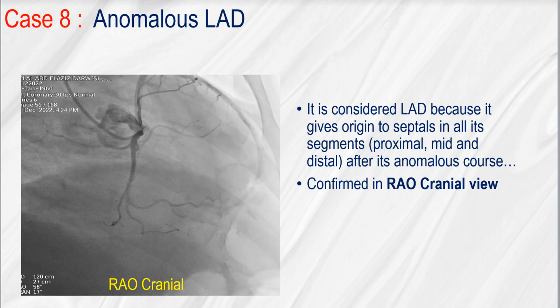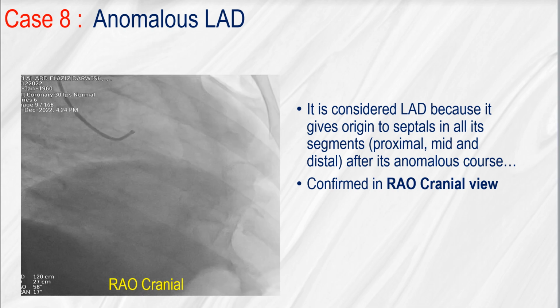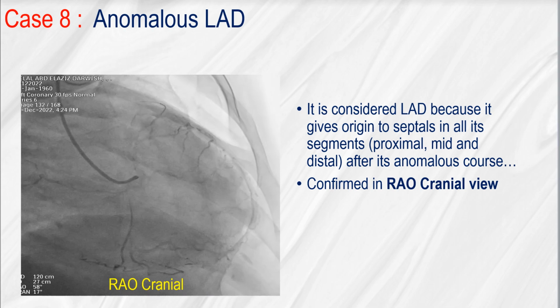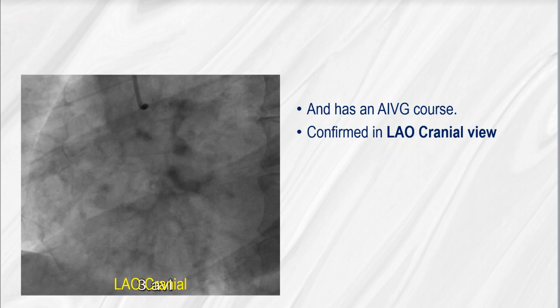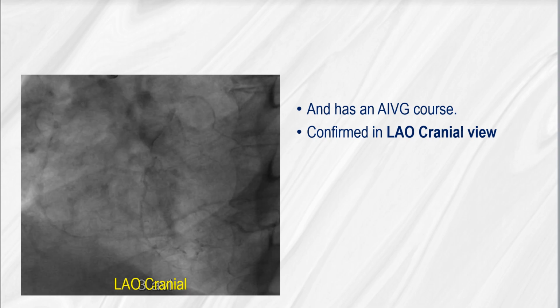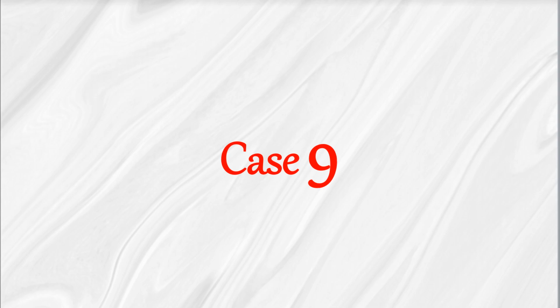It is considered LAD because it gives origin to septals in all its segments, the proximal, mid, and distal, after its anomalous course. This is confirmed in the RAO cranial view and has an anterior interventricular groove course. This is confirmed in the LAO cranial view.